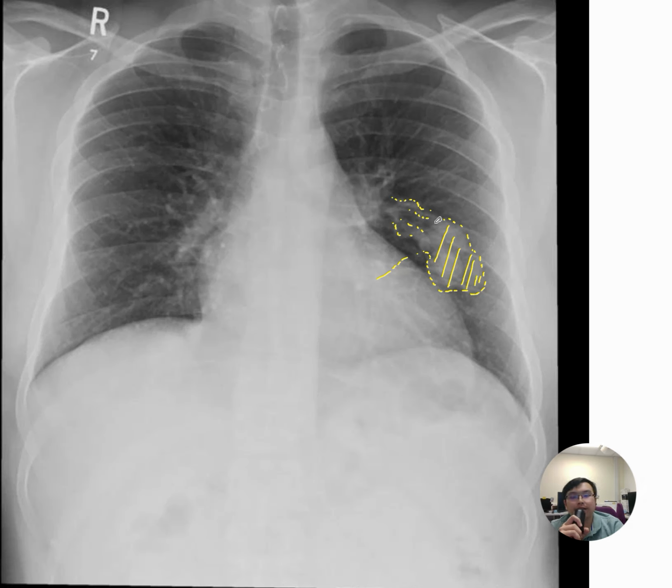So actually, this appearance is highly suggestive of a pulmonary arteriovenous malformation. When we consider this possibility, it is actually very rarely seen sporadically in normal individuals. But we need to consider the possibility of an underlying syndrome like hereditary hemorrhagic telangiectasia (HHT), and this kind of patient commonly will have different kinds of AV malformation throughout the body. Lung, liver, and the brain are the most classical positions.